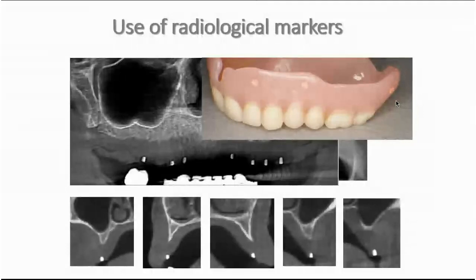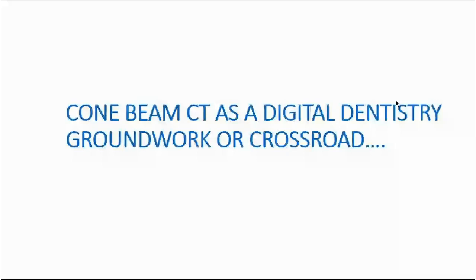So this is something which doesn't cost almost anything, but it gives us a lot of information, at least about the position, and it could just speed up a little bit the initial drilling or the positioning when the drilling procedure is done for our patient.